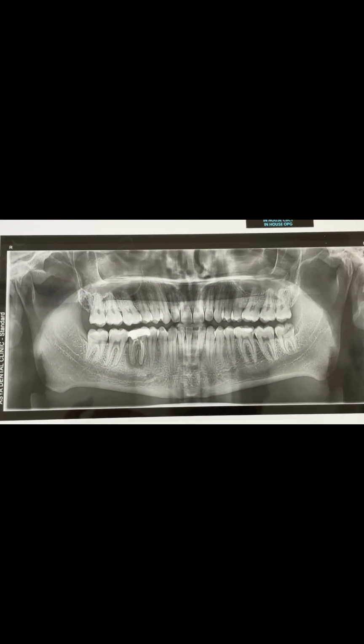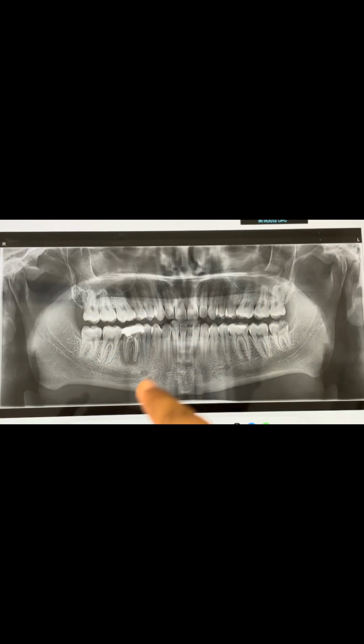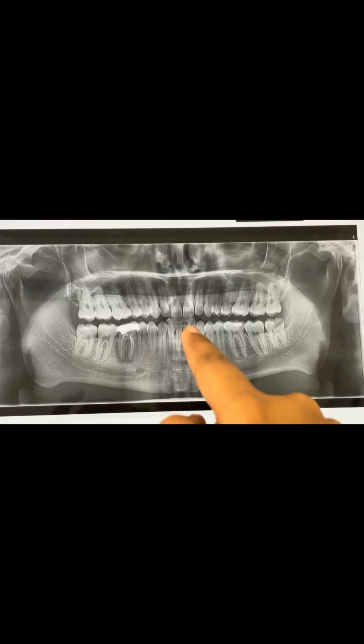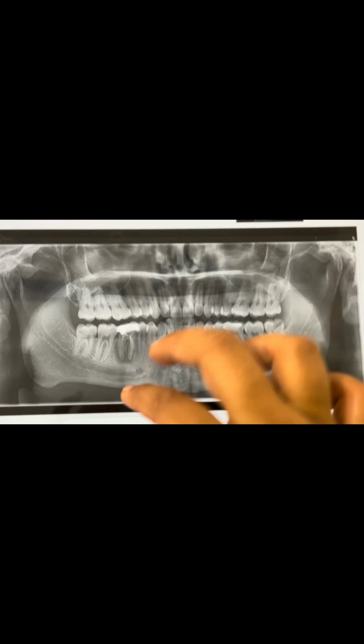After all of the bony landmarks, now you move towards reading the teeth that are there. If you see the number of teeth in this particular case, moving towards the center, this is an extra tooth. It's a retained deciduous, and let me show you why we can identify it as a deciduous tooth. Like you can see, the root seems shorter. The tooth crown length is also shorter.